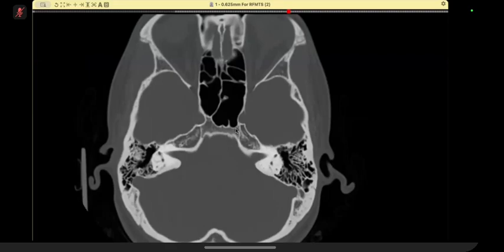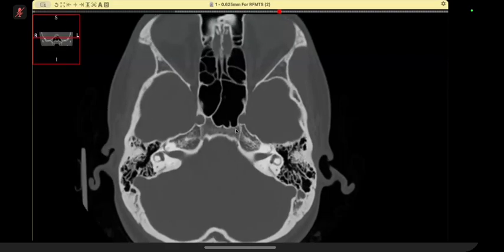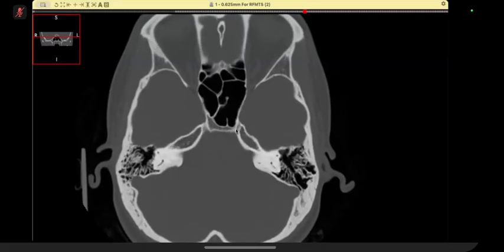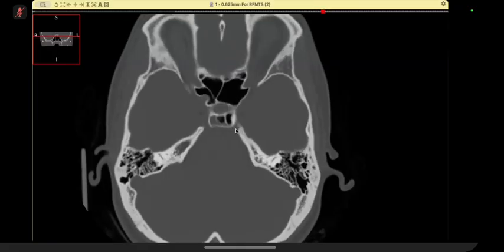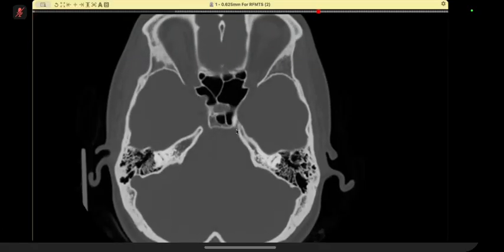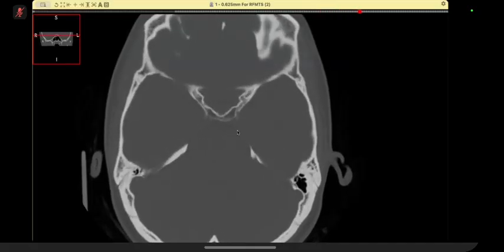Okay, so let's start. I will scroll through it, because the main idea is anatomy. So keep listening. I'm scrolling through it, and then at a particular point, I'll start asking questions from you. Okay, so sir, we are going superiorly.